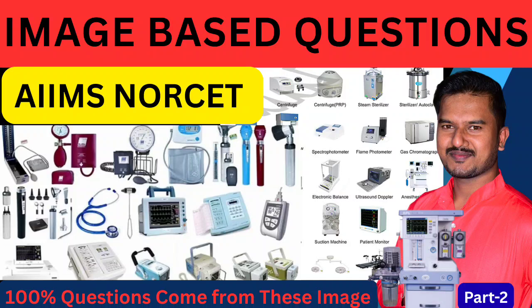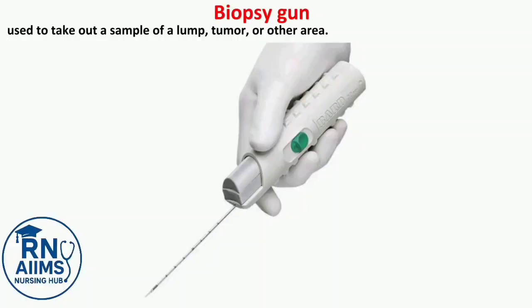Today in class we will discuss image-based questions for NORCET and other nursing competitive exams. So let's begin. Biopsy gun. Used to take out a sample of a lump, tumor or other area.